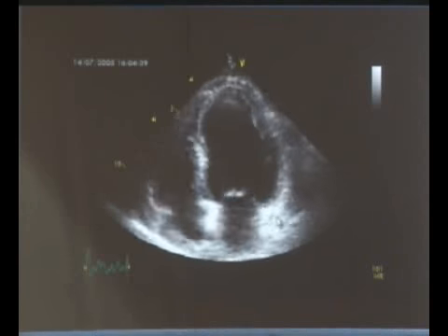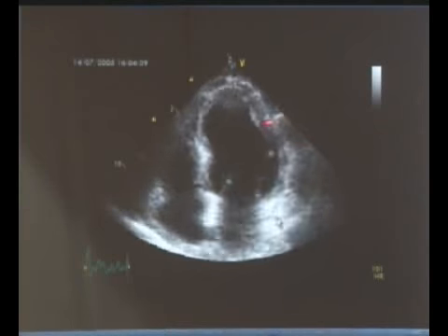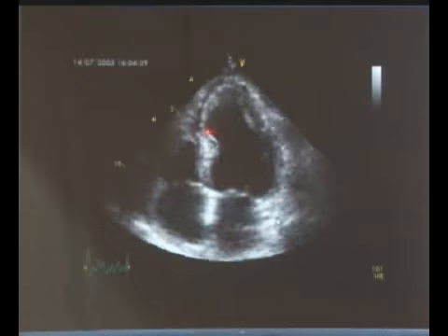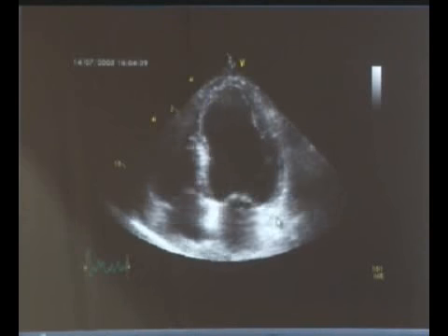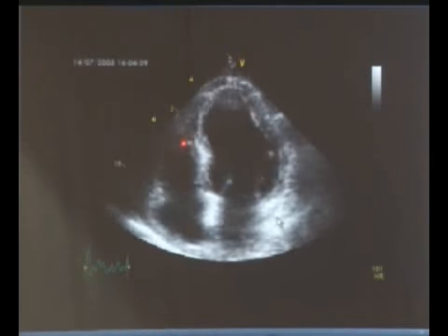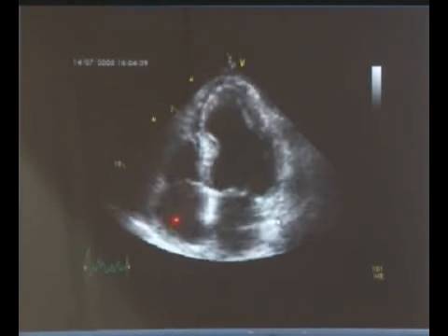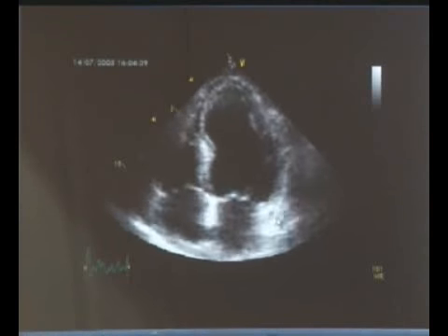So, in this patient what do we have? We have mid and basal lateral wall which is hypokinetic and possibly mid septum or part of the apical septum which is akinetic. So, I am dealing with two coronary artery territories. One is the circumflex, one could be LAD or RCA. And if I have a right ventricular wall motion abnormality along with it, possibly I will say I am dealing with RCA. Are we clear?